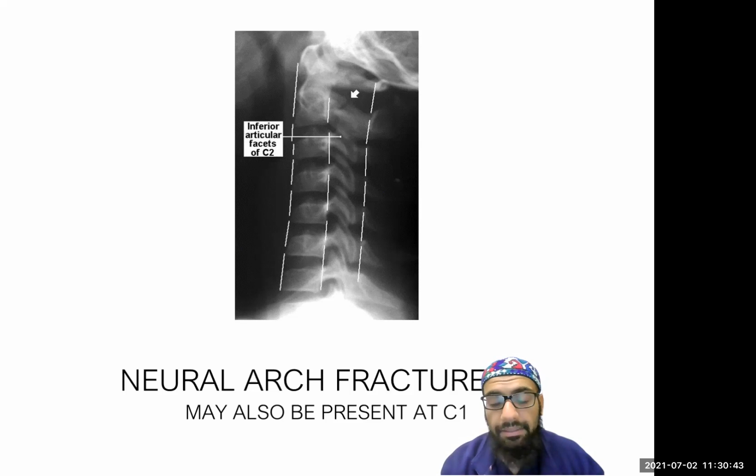Whenever you see this, don't just assume it's only muscular spasm. There may be fractures that are lurking over there, and you've got to have a good look at it. All right. And in the absence of the straightening, it doesn't mean that there's no fracture as well, but it's just a little tip for you guys.